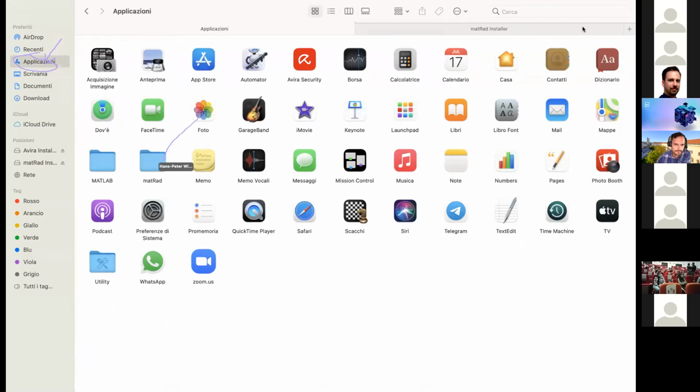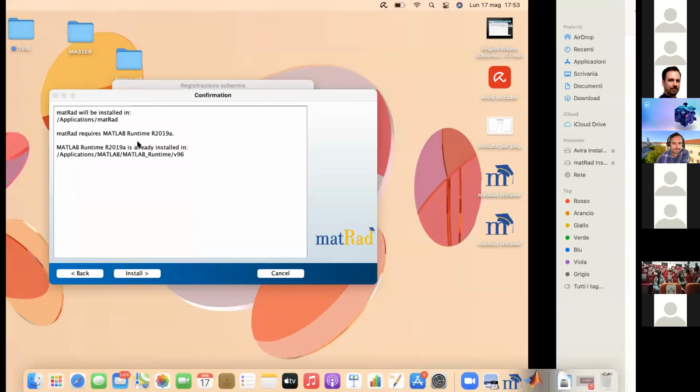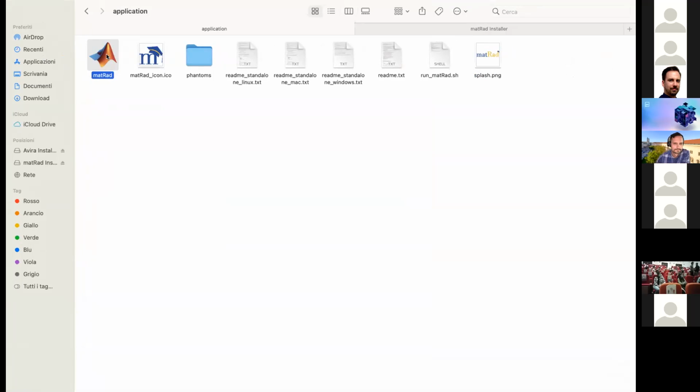And there it is. Then you go to applications, and then this one. Yeah, right click. Open. Good. Thank you a lot. You're welcome. And the phantoms can also be found here in that folder. Exactly. So I have to wait a minute for the opening, I think.